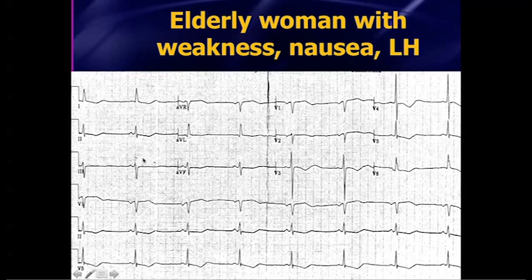And what else? There is a lot of T-wave flattening, a little T-wave sagging down here in lead 2, some T-wave flattening in V2, and biphasic T waves in V3, V4, V5, and some ST segment sagging in V6. Now, most of you are probably thinking about Wellens whenever the term biphasic T waves is heard and referred to in the mid-precordial leads, V2, V3, V4. Everyone's thinking Wellens syndrome. And for those people that don't recall, Wellens syndrome is an electrocardiographic T wave abnormality associated with a critical occlusion in the proximal LAD.